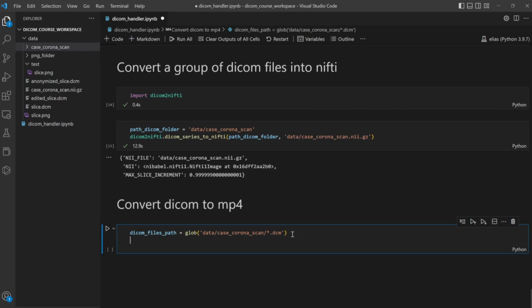The second thing that we are going to need is the frame size. When you are going to create a video, you need two parameters: the frame size and how many frames per second you want to have in your video. For the frames per second, let me choose, for example, 15, because I tried multiple values, and sometimes the video is very slow, sometimes it's very fast.